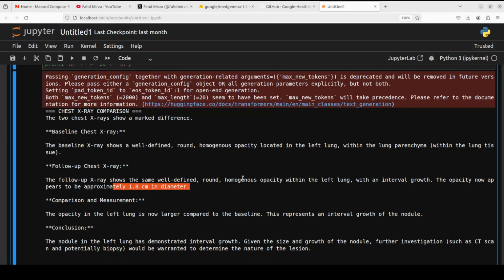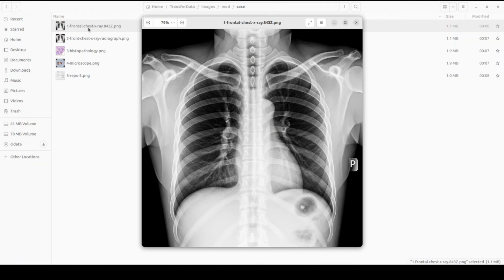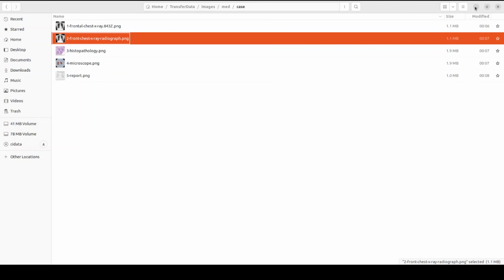So if you are a medical practitioner, please confirm what you think about this, because of course I can just tell by visually looking at it or at what the model has prescribed. Okay, so that is good.